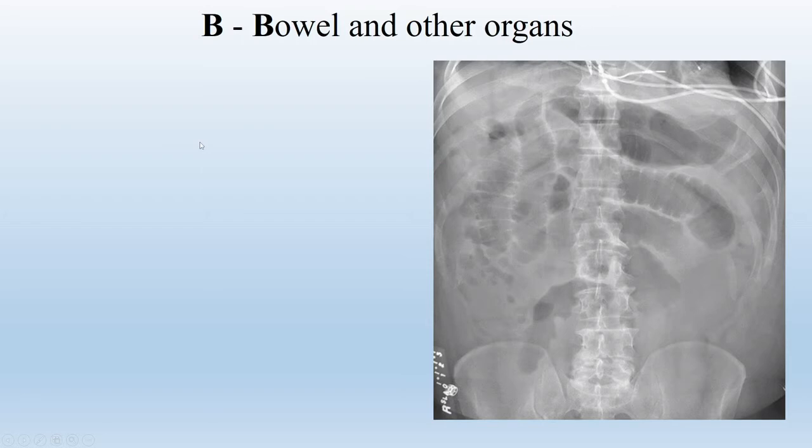So here is another case, abdominal X-ray, and here we can see those mucosal projections. Again, to differentiate, first you think about location. This bowel is located centrally, so that's a hint it might be a small bowel, and again you see that these mucosal projections cross the whole lumen of the bowel.